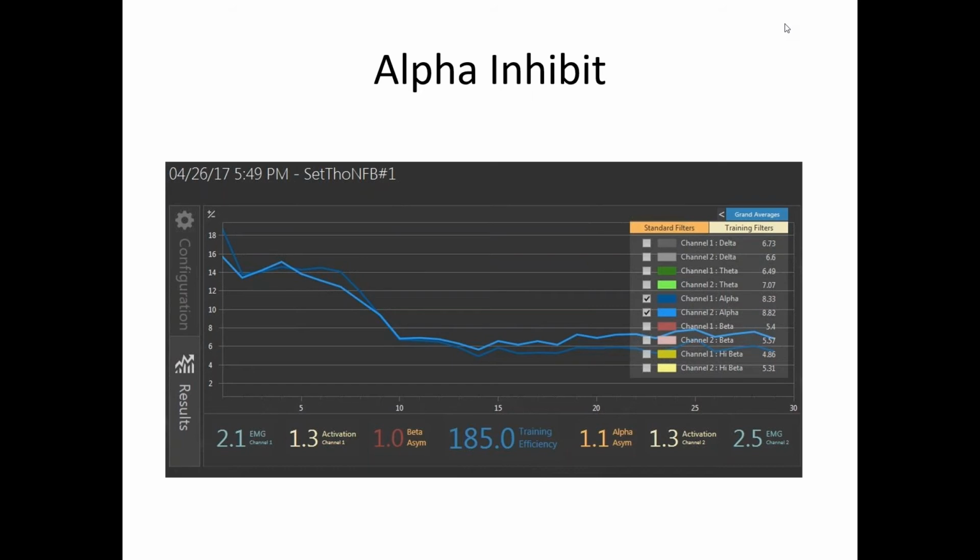I see people get really confused sometimes when they're just looking at the trend screens because they're setting a goal in their mind for how it should go, like, well, I want to train theta down, and the client's not getting better if the theta is not going down as much as I expect, when in fact they're not looking at all the other lines which are rearranging themselves. Which might be a bias. It might be a bias, you know. If I only focus on theta and don't look at what's going on with the other component bands, yes, I might completely miss a dramatic progress.